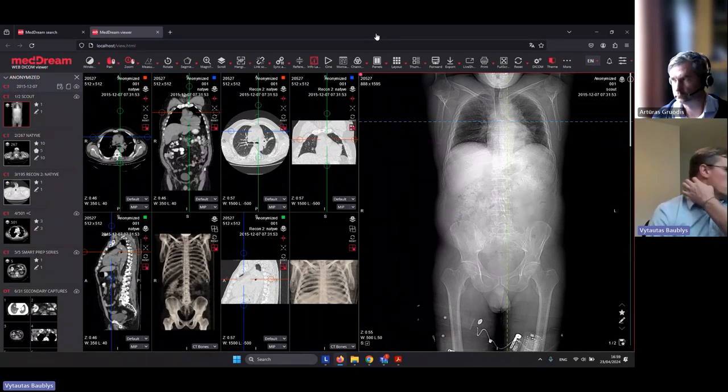But I hope in the very near future you will have the possibility to propagate the crosshair even from the MPR view. For now, you can overcome it by putting aside an additional 2D image on which you can use the crosshair, and you can then move and align the MPR views.